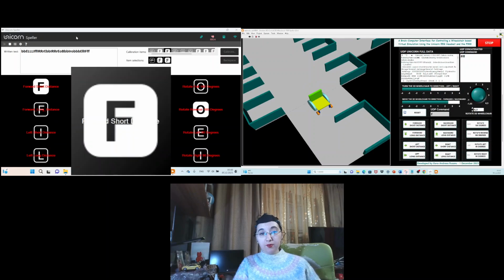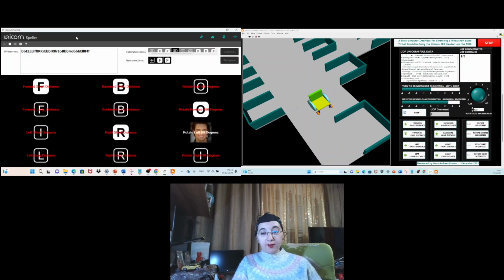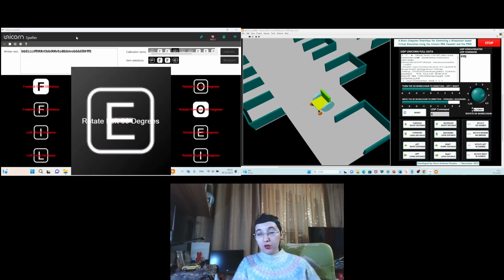That's really nice. Then further, rotate left 90 degrees. Okay, you can see the wheelchair.